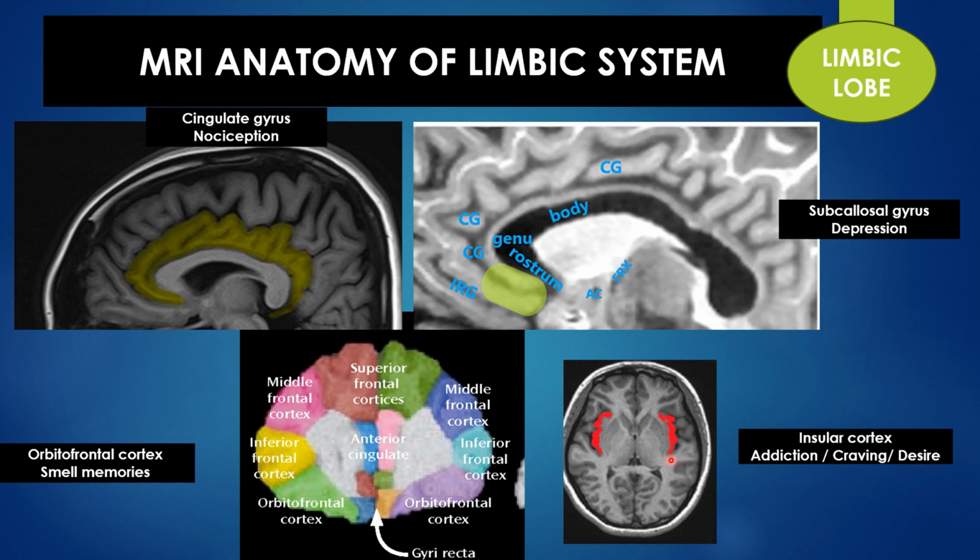Insular cortex, we know this very well actually. This is something which we commonly keep reporting and saying. This deals with addiction, craving, and desire.